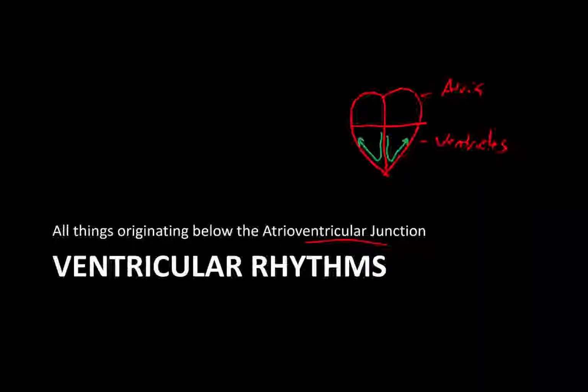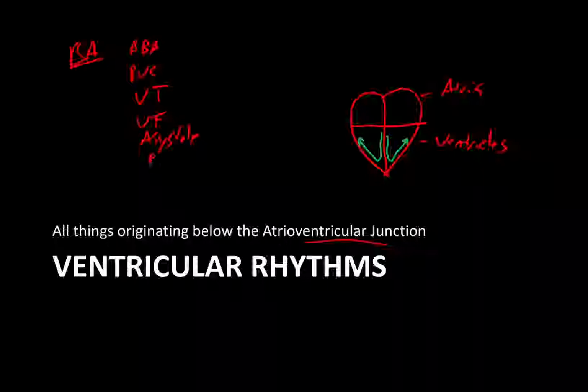To just kind of recap or just give you a rough outline, for the basic arrhythmia folks, it's going to be pretty straightforward stuff with bundle branch blocks, PVCs, VTAC, and VFib. Asystole and PEA.